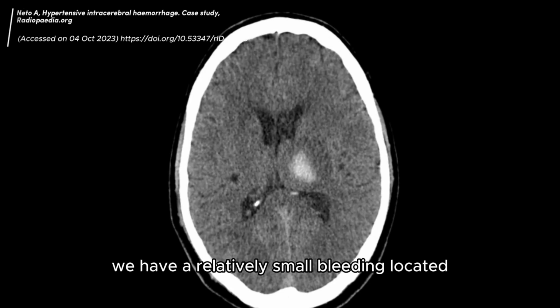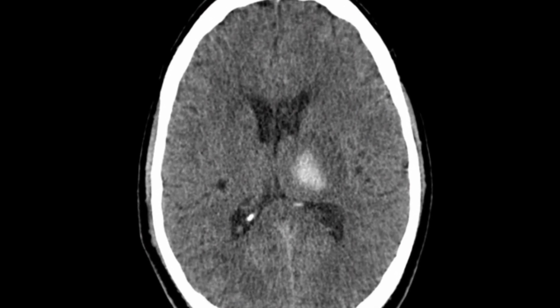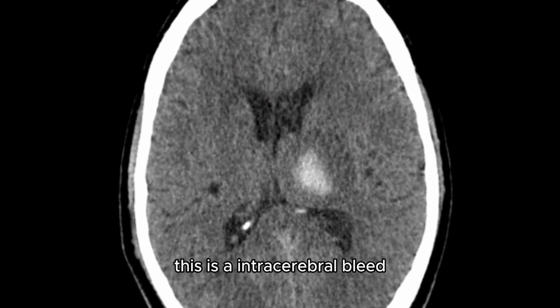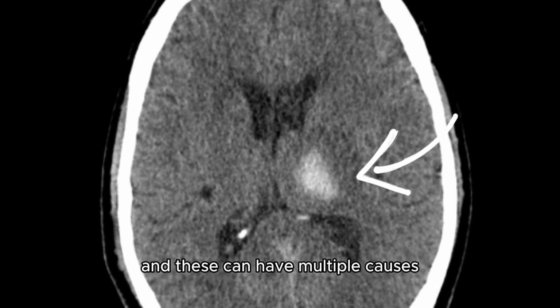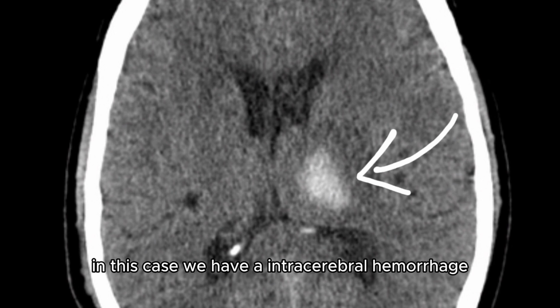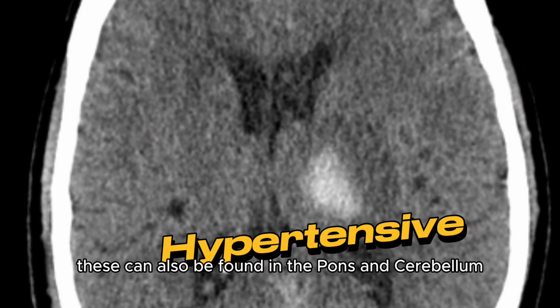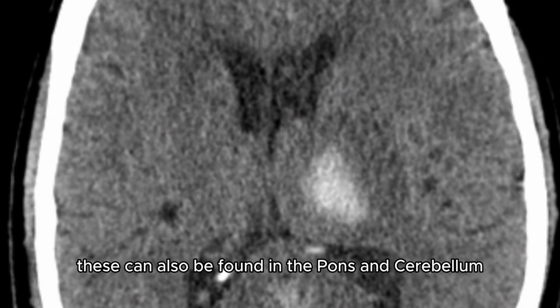In this case, we have a relatively small bleeding located within the left thalamus. This is an intracerebral bleed, and these can have multiple causes, either primary or secondary. In this case, we have an intracerebral hemorrhage with a classic location for hypertensive bleed. These can also be found in the pons and cerebellum, although not as common.